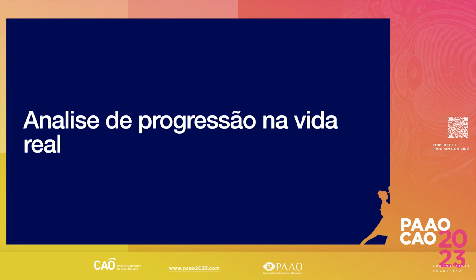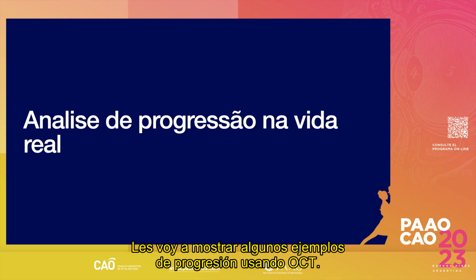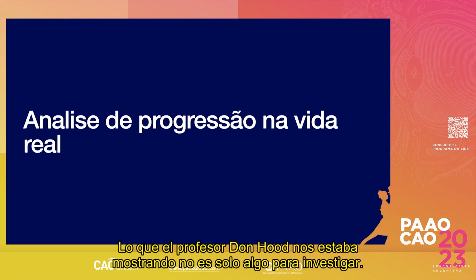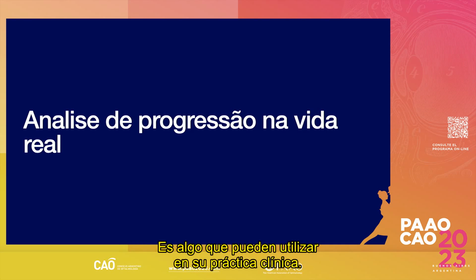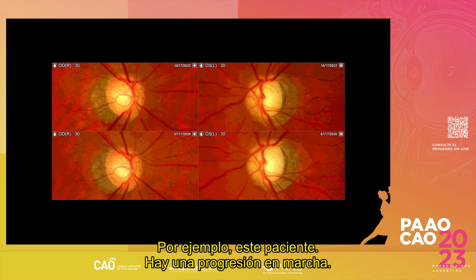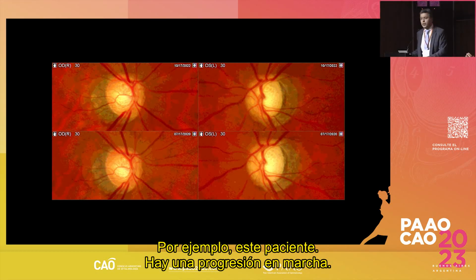I'm going to show you some examples of progression using the Topcon OCT, and telling that what Professor Don Hood was showing us is not just something for research. It's something that you can use in your clinical practice. For example, this patient here, I'm telling you that there's a progression going on.